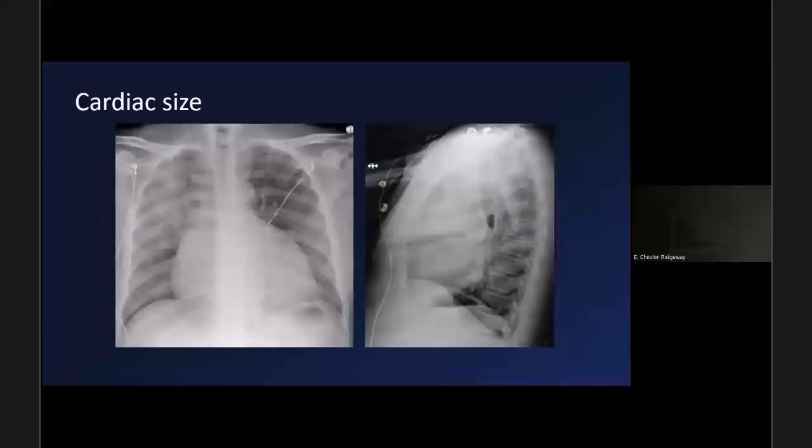So in this patient, this patient had new cardiomegaly. From a year ago, his heart was normal size, and now we have his heart's massive, unfortunately, on this. What this ended up being from, and this is why it's important for you guys at least to be aware, he had a new very large pericardial effusion, and you can actually see it on the lateral really nicely. Again, a little bit more advanced, but this kind of wider region here is the heart.